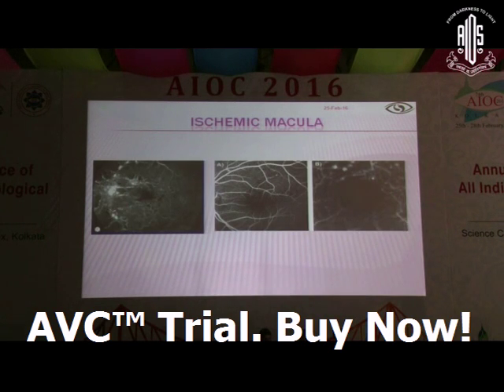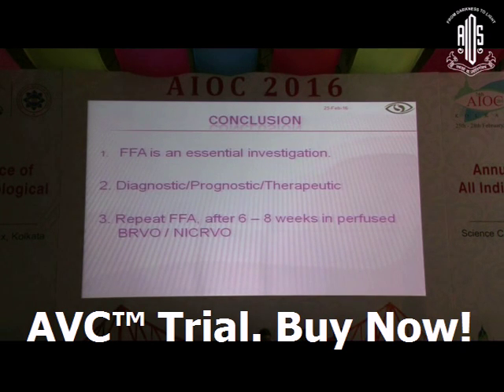And as you see, depending on the involvement of the foveal avascular zone, you can have an ischemic macula, and if there is an involvement of the foveal avascular zone, the prognosis tends to be bad.